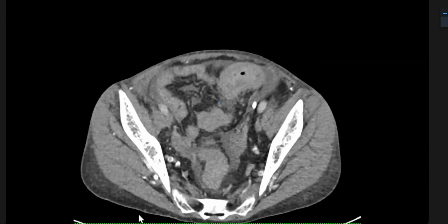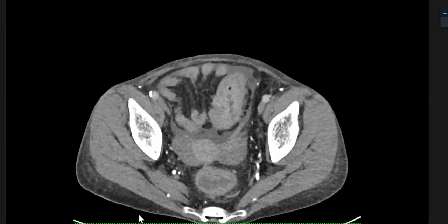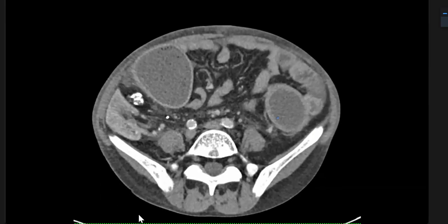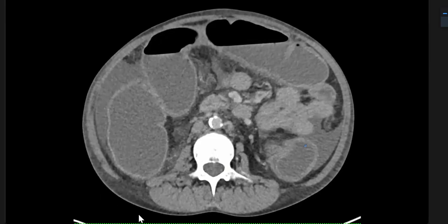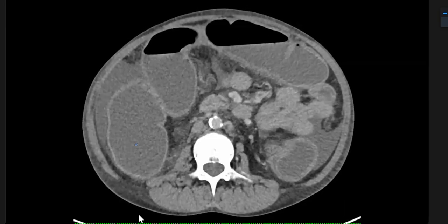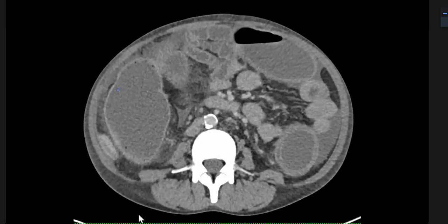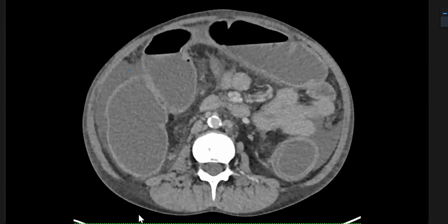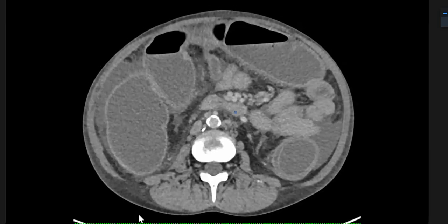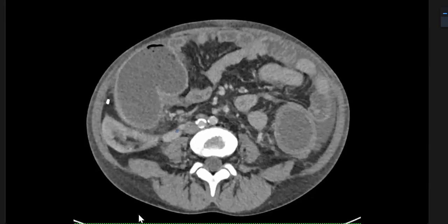I think that is the large bowel loop, and there is an intussusception going on at the level of the sigmoid colon, which is resulting in retrograde dilatation of the large bowel, and that is the massively distended descending colon as well as the transverse colon and the cecal region with an imminent perforation, because the cecum is massively dilated and there is adjacent free fluid as well. I cannot see any areas of free air adjacent to it, but the small bowel centrally is collapsed. It is lying in the central part of the abdomen. There is hazy mesentery and there are multiple lymph nodes as well.